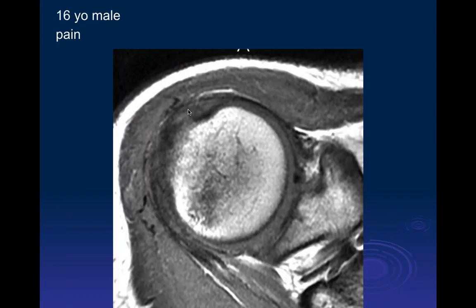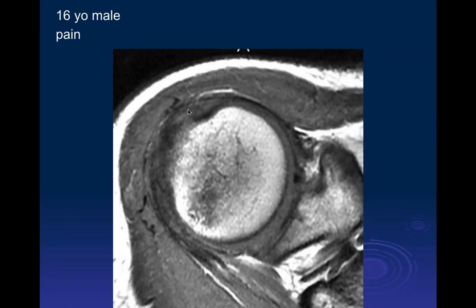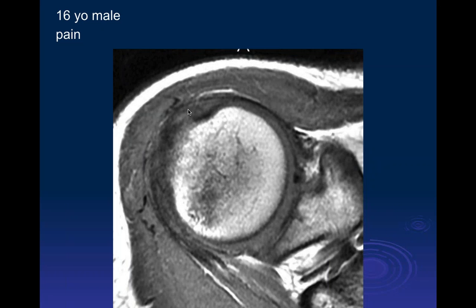16-year-old male with pain. Okay, so yeah, I guess we're looking at perhaps a congenital issue. The issue here is what should be there that you don't see, and these can be difficult. Yeah, these are usually tough for me.